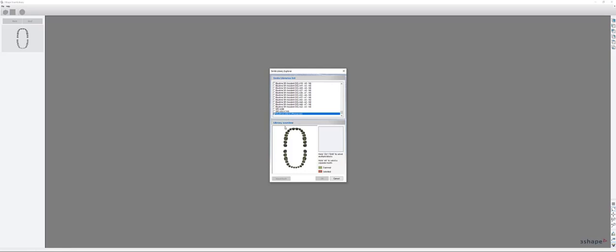This is going to bring you into your 3Shape Scan It library. This is where we're going to modify our current smile library. As you can see, my modified A66, A7 Finalizing L5 is on the anterior of the upper, just to see what the teeth look like. So they do look like my A66. So I'm going to leave that alone.